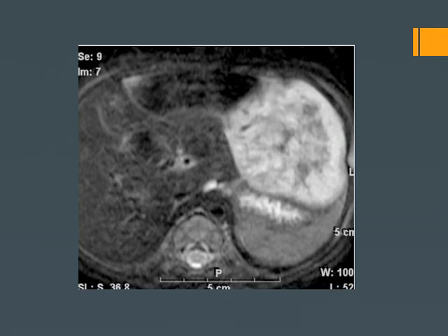Here, an infant with an incidentally found liver lesion underwent an MRI. This T2 sequence demonstrates a well-circumscribed mass of approximately 6 centimeters. This lesion involuted over 1 year without any therapy.